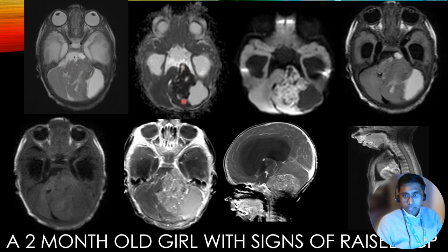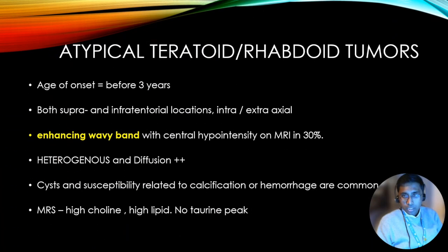So we can see that the mass is both cystic as well as solid, and the solid component of the mass is showing intense post-contrast enhancement, and even the margins of the cyst are showing post-contrast enhancement. So in a 2-month-old girl, remember the age is quite critical here. Any child less than 1 year, we would think of ATRT in the posterior fossa, and this also turned out to be the same. Remember, they can be both supra- or infratentorial.